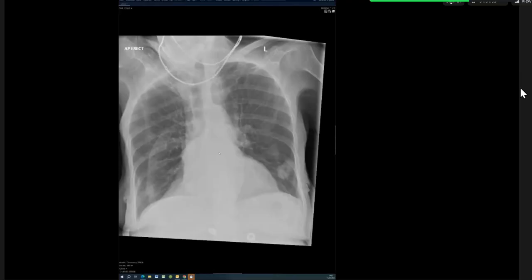Once you've done that, you have to say, I would highlight the report to the referring clinician for urgent referral to the lung cancer pathway. The patient needs further cross-sectional imaging, and then they would show you the cross-sectional imaging, and then you would say you would ideally like to stage it. You would refer it to the MDT. You have to say MDT. You have to be safe. You have to make sure we highlight urgent reports to the referrer, because these are the safety points that they're checking. Does that make sense?